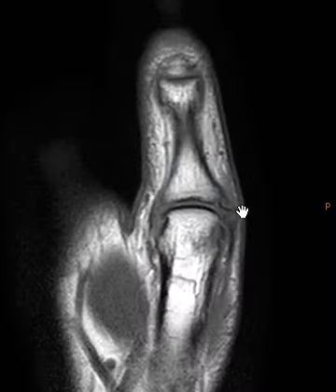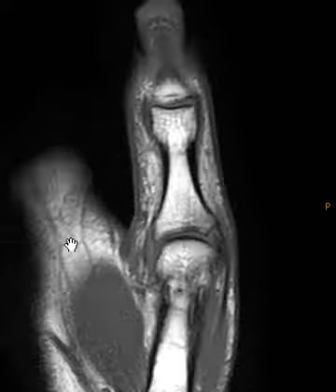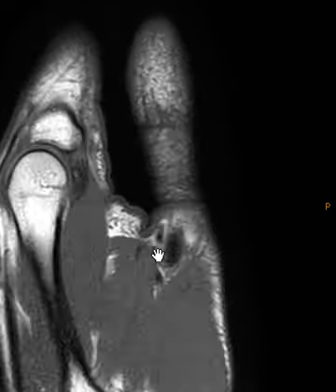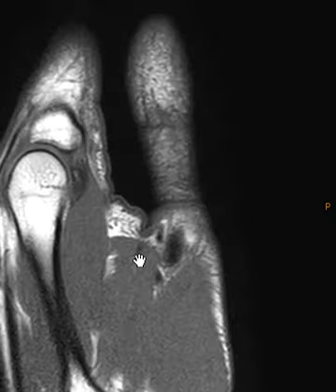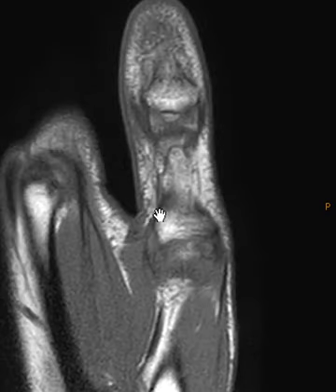If we look at the coronal view, we can see the thumb. Here it is. There's the thumb. We have the ulnar side. This is towards the hand. The ulnar collateral ligament. We should see a dark band here, but we do not. It's gray, and so the ulnar collateral ligament looks like it's partially torn. And then this is the adductor. See that central tendon and then the muscle. And that central tendon is going to come over here, fan out, and attach over here in this broad aponeurosis. Again, that's superficial to the ulnar collateral ligament.